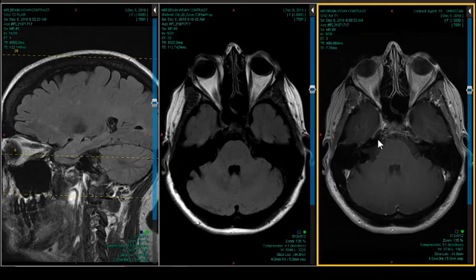And one thing I do see, we've both seen it together, is enhancement of the 7th and 8th nerve complexes. It is a cause of facial palsy, Bell's palsy. It is a cause of hearing loss. It's a cause of labyrinthitis. So that aspect of this case is okay for Lyme disease. You want it to occur when the deer tick is out and about, which is usually the spring and summer and fall. So, if you're diagnosing a new case of Lyme disease in Toronto in 30 degrees below zero, you're probably off base by a lot.